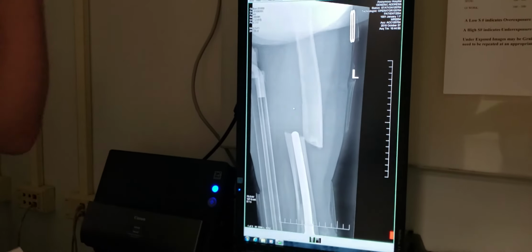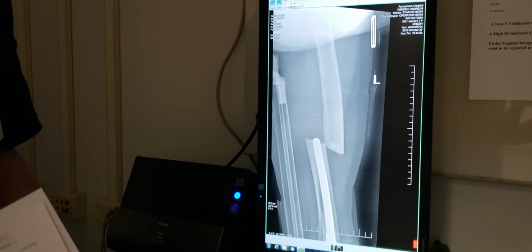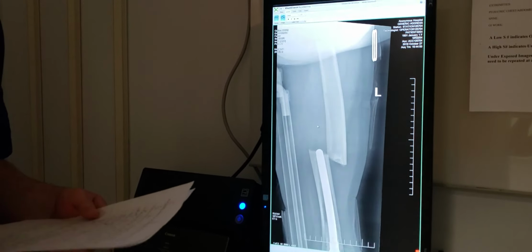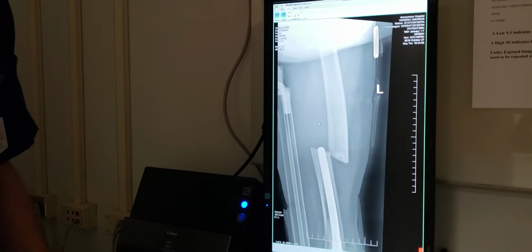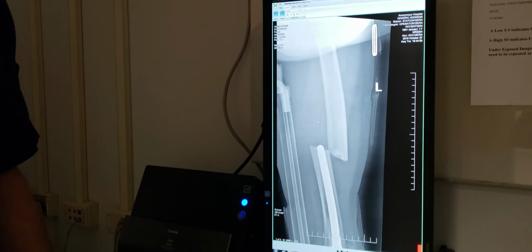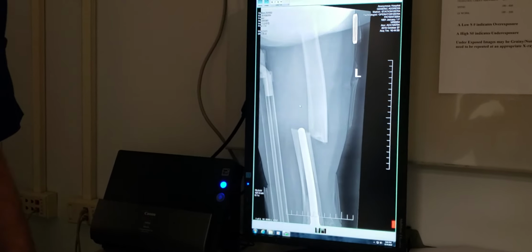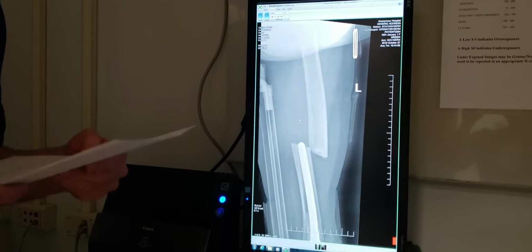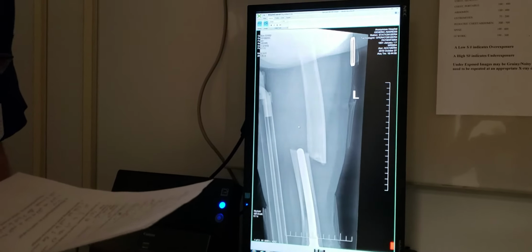I would say that the mid shaft down to the knee joint, since it's not included, is well demonstrated. It's clear of all this stuff on the sides. There's no unintentional rotation or rotation that the tech could have fixed to make the image better. I think that every bit of rotation in here is as much as the tech could obtain with a patient that's split their femur into 2 pieces. The marker was implanted. It was probably sitting right outside the image.